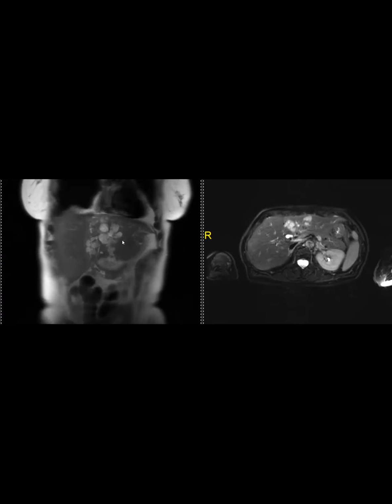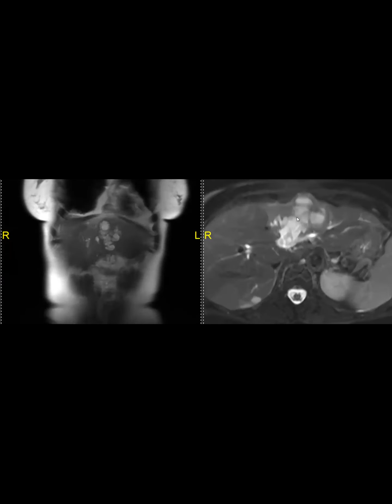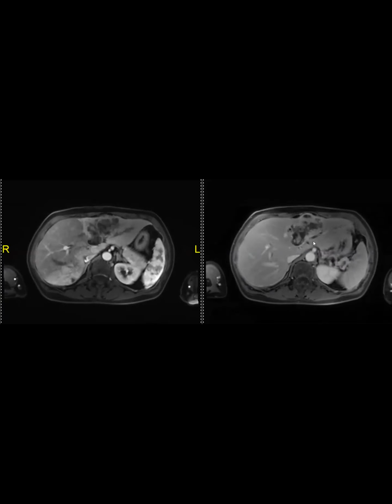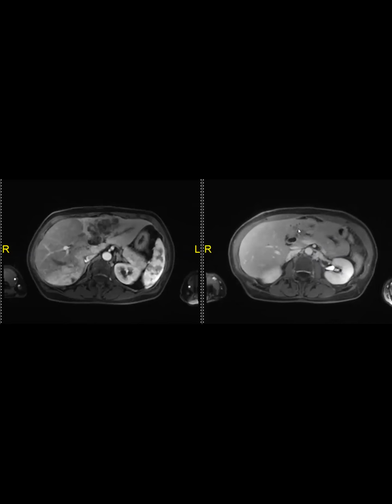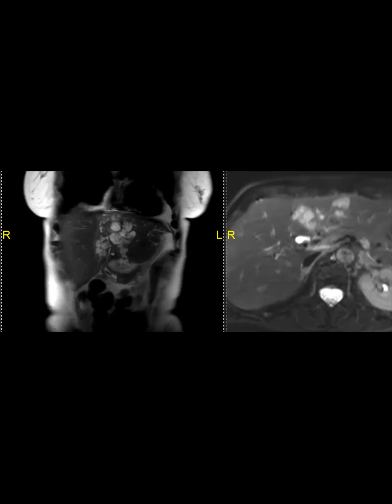You could see just a really dilated mass-like dilatation, right, with debris and almost a frond-like appearance inside. And then here it is on pre and post gad, you can see again these frond-like enhancements. And then the interesting part on coronals, you can see right there. Let's see if I can tighten this up so it's clearly seen.